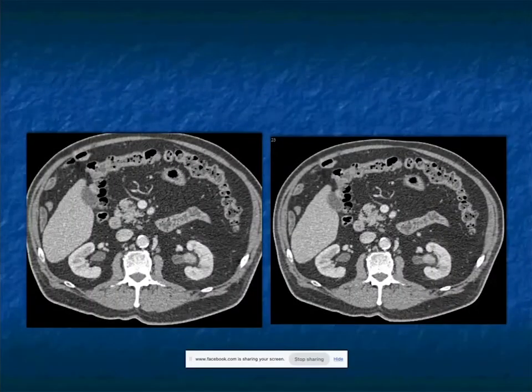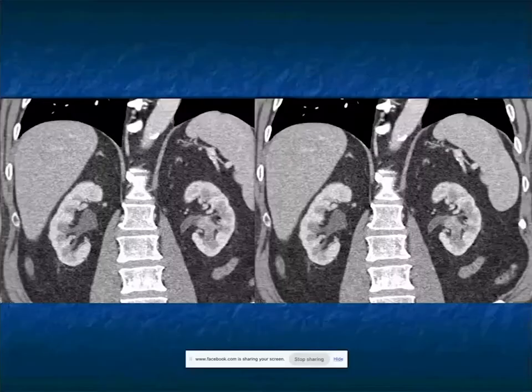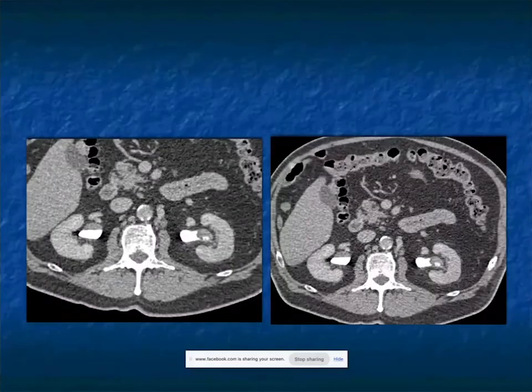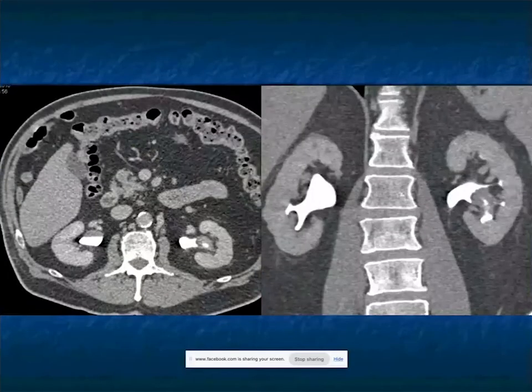And here it is on venous. You can see it. It's slightly enhancing. It's filling in the calyx, extending into the pelvis. And of course, you would expect to see this really nicely, and you do on the excretory phase imaging. So what are you thinking about? Mass infiltrating the renal pelvis, involving and probably arising from the lower pole calyx. This is a classic example of a transitional cell carcinoma of the kidney.